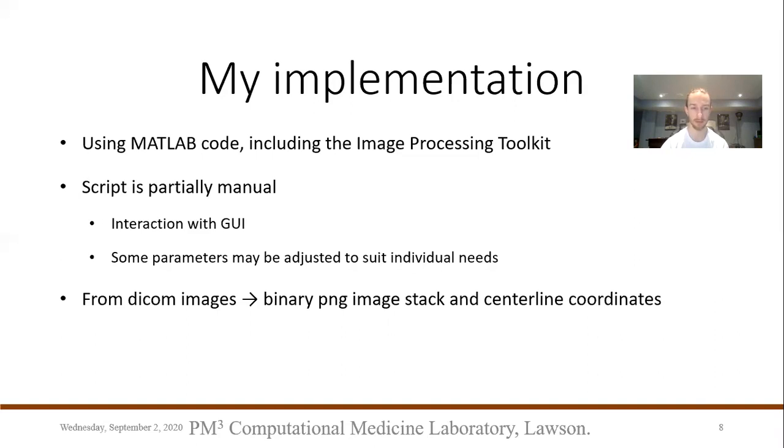My script is partially manual, meaning that I have some interactions with the MATLAB GUI, as well as a lot of parameters that can be adjusted to suit any individual needs, whether that be adjusting thresholds, or anything to deal with your specific geometry or contrast level. What my MATLAB code does is it loads in some DICOM images, processes them, and then exports a binary PNG image stack and a list of centerline coordinates.